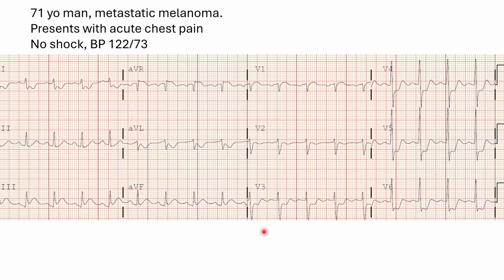And as I will describe in a little bit, diffuse ST depression with ST elevation in V1 and or aVR is not a STEMI equivalent. It is suggestive of profound ischemia, potentially in the left main, but it's not a STEMI equivalent. So we don't need to rush those patients to the cath lab. Unless ST abnormality is profound and persistent, which was the case of this patient. That is why we took him urgently to the cath lab and found severe left main and LAD disease along with RCA CTO as we expected.